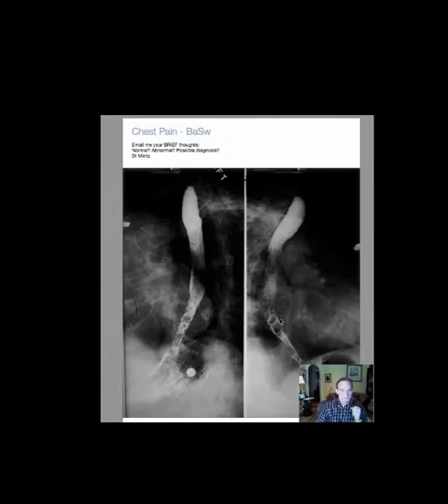The fact that on both of these views you're not distending the esophagus well suggests that there may be some narrowing, an abnormality involving narrowing of the distal esophagus. And even here, there is a little filling defect or an impression upon the esophageal lumen, and you see it here in another projection.